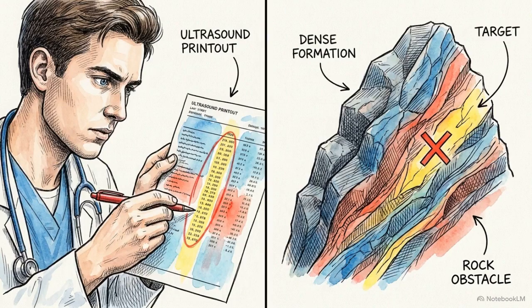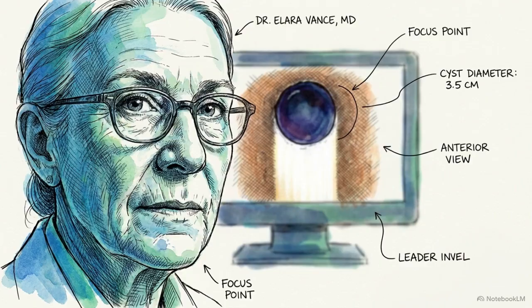A novice relying purely on visual cues might mistake that bright area for dense tissue or a solid tumor, but acoustic enhancement proves the overlying structure is purely fluid. The visual glitch is actually a definitive physical confirmation of a cyst.